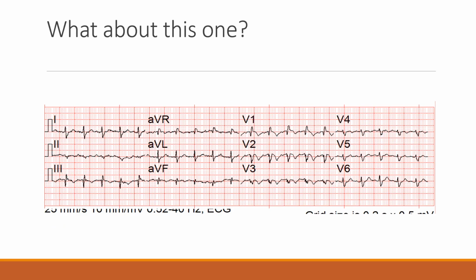So I want you to take a look at this one. This is where a lot of people, again, don't want to commit this to memory. This is where this saves a human life. So a little backstory on this patient. This patient called for syncope and presented to the crew tachycardic, as you can see there, with orthostatic syncope or near syncope type symptoms.